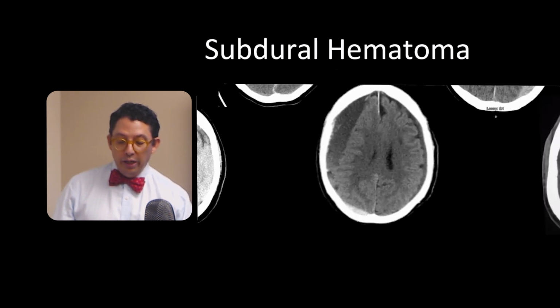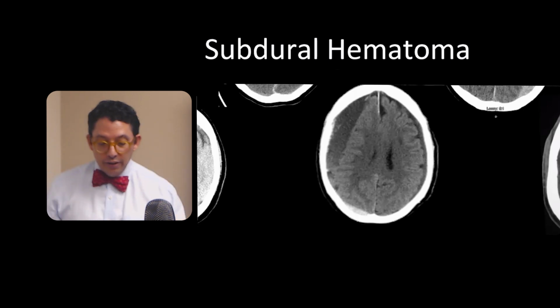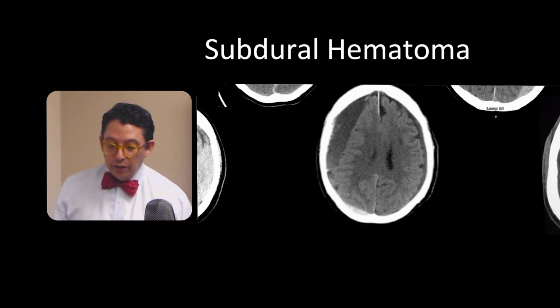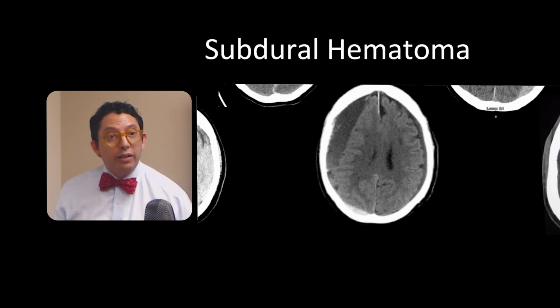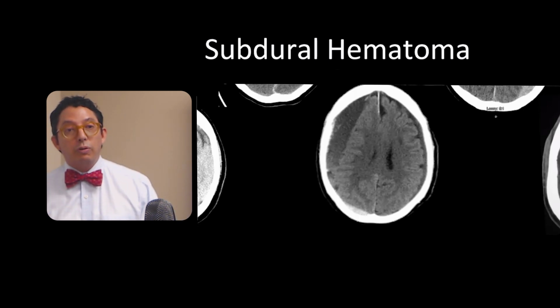This one that you're seeing here is actually mostly dark. So this tends to be a chronic subdural on both sides, but if you look carefully, and this is where it's really sneaky, is that you have little streaks of hyperdensity in this chronic bleed. This is a patient that has an acute bleed on a chronic subdural.